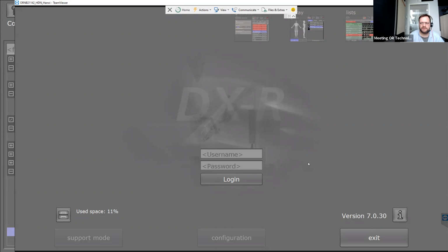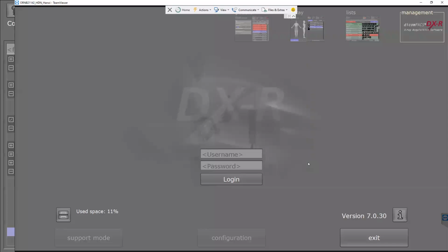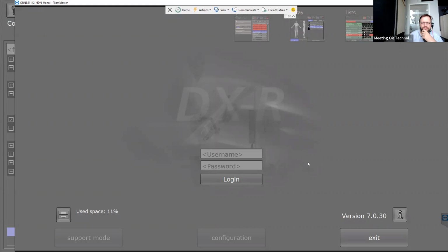Yes. Can we set up the patient ID to begin with desired characters? For example, a 6 character ID like ABC 1, 2, 3. After that the software can generate the next patient ID automatically, like ABC 1, 2, 4.